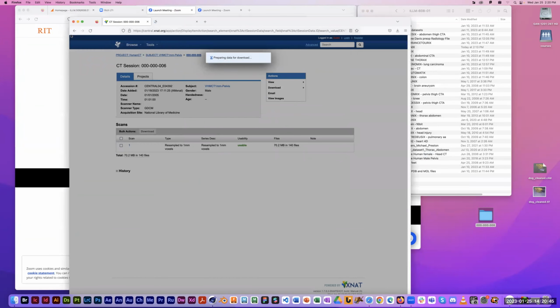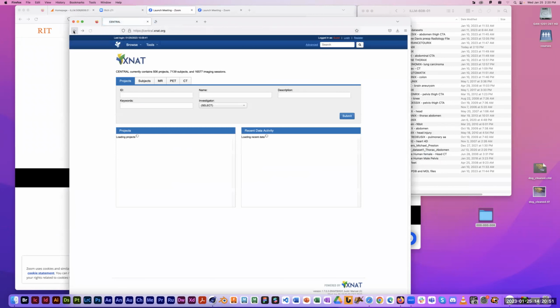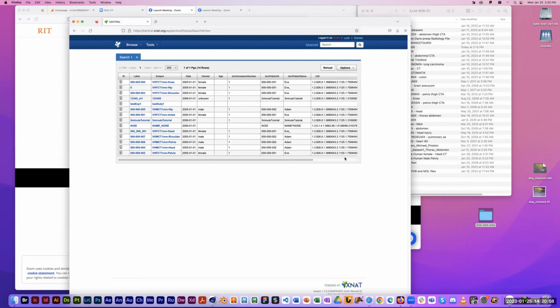So you could go back in here and, all right, I think I have to go all the way back to the beginning and search for CT data sets again. Now, if I wanted to get, say, his shoulder or his head, I could click on those links and go through that same process. So like I said, you can do that with the visible human male or the visible female.